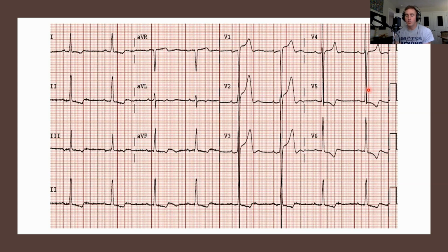So long story short, if you see this pattern, think twice, call in your report, let the hospital know there is ST elevation but that you think it's due to left ventricular hypertrophy, and that you would like them to overread the EKG and make that decision when you arrive in the ER.